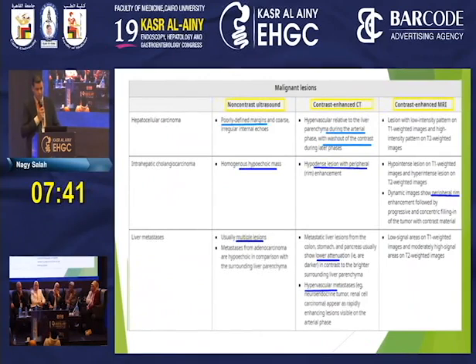Cholangiocarcinoma may be hypoechoic in ultrasound, hypodense in contrast-enhanced CT, with peripheral delayed rim enhancement. On low T1, high T2 MRI, dynamic images show peripheral rim enhancement followed by progressive concentric filling of the tumor with contrast material. Liver metastases are usually multiple lesions.